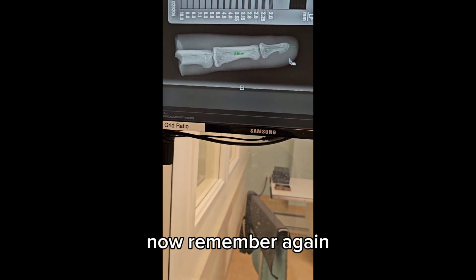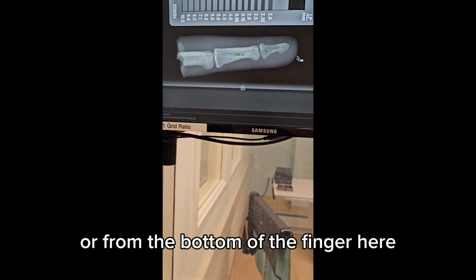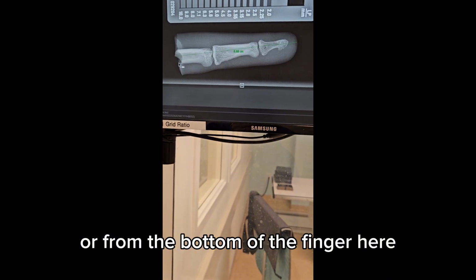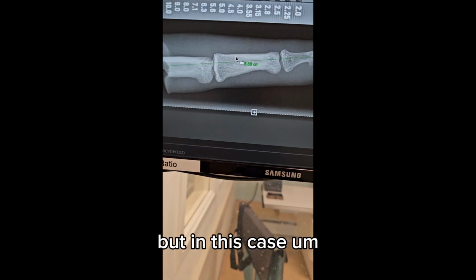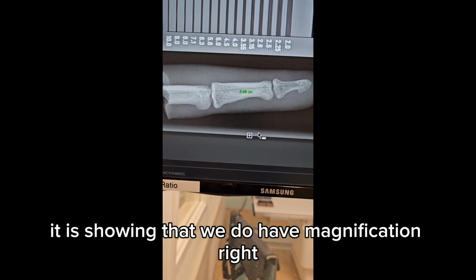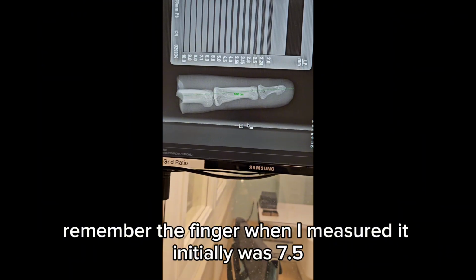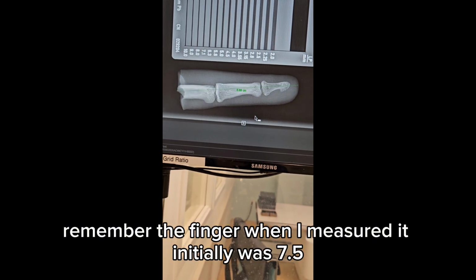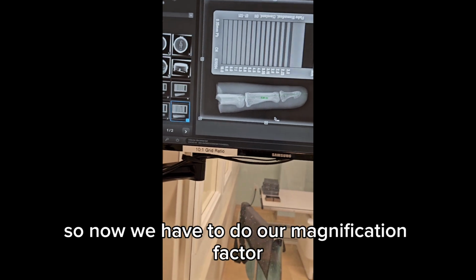Now remember, again, this can be subjective, right? I could measure it from here to here or from the bottom of the finger here. It's going to basically be similar numbers, but in this case, it is showing that we do have magnification, right? Remember the finger when I measured it initially was 7.5.